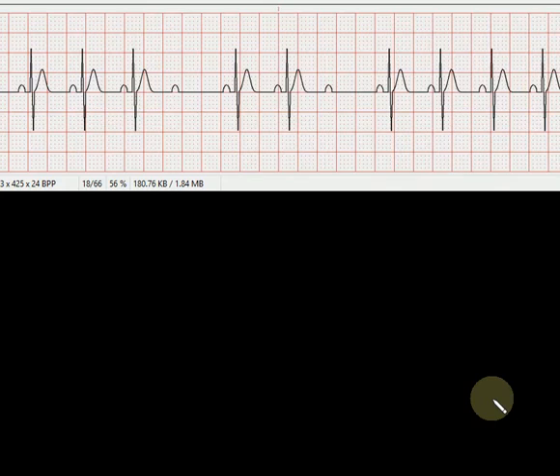If you remember, I gave you this pair of rules. If I've got more P waves than QRSs and consistent PR intervals, that combination tells us we've got second degree type 2. I'm adding in an extra thing here, so I've got to switch over to the tablet, and this is second degree type 2.